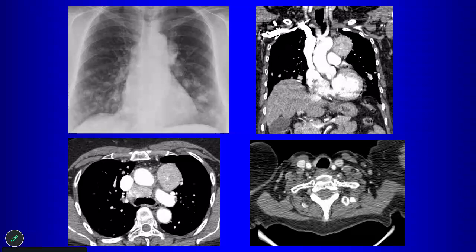Anything about the last image that helps you here, Sawan? Yeah, the thyroid is missing. So this patient has status post-thyroidectomy for thyroid cancer. So this is recurrent thyroid cancer presenting with hypervascular metastases. Okay.